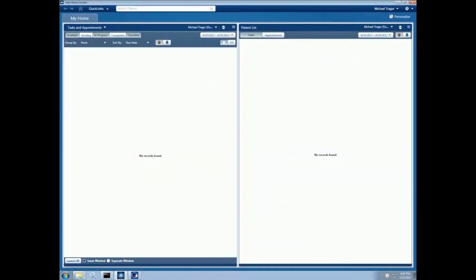This is the home screen of ARIA. ARIA is a comprehensive information and image management system. ARIA lets you oversee all aspects of oncology care. All radiation, medical, and surgical oncology information are kept here in a complete oncology-specific electronic medical records database that allows you to manage the patient's entire treatment, from initial diagnosis through post-treatment follow-up.